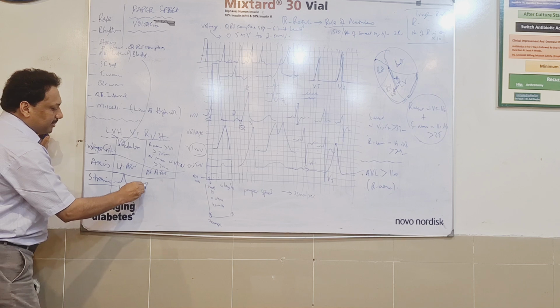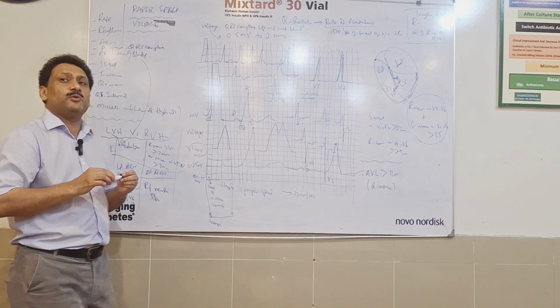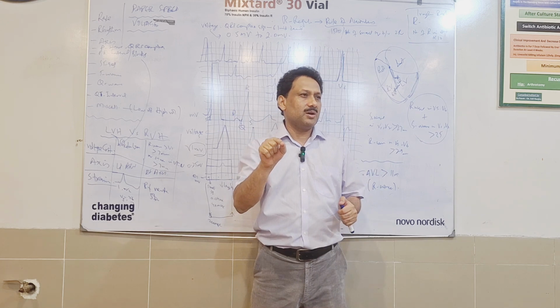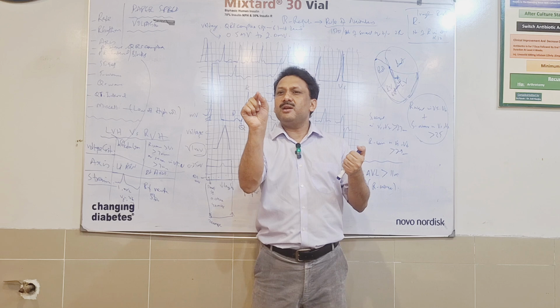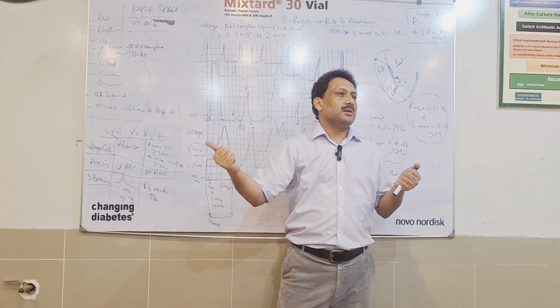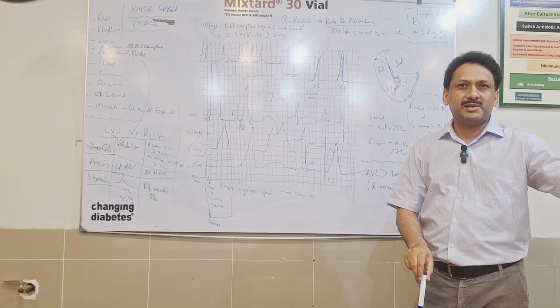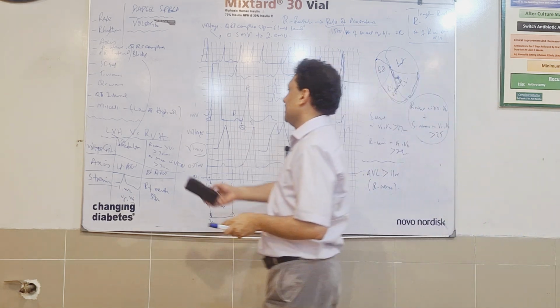And in right ventricular hypertrophy, there would be right ventricular strain. Can somebody tell me where would be that strain? The right ventricular strain on ECG in chest leads. Which chest leads are we supposed to look for? V1, V2. In V1, V2, if you find the strain pattern, again these sort of asymmetrical T waves, we will label it as right ventricular strain. So we are over with left ventricular hypertrophy criteria and right ventricular hypertrophy criteria.